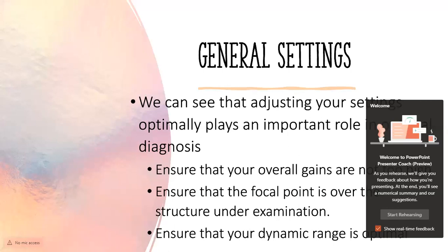Just in general, we can see that adjusting our 2D settings optimally plays an important role for us in diagnosis. Ensure that your overall gains are not too high. Ensure that your focal point is over the structure under examination. And ensure that your dynamic range is set optimally.